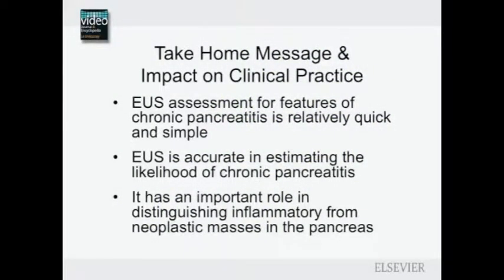In summary, the EUS assessment for features of chronic pancreatitis is relatively quick and simple. EUS is accurate in estimating the likelihood of chronic pancreatitis, and it has an important role in distinguishing inflammatory from neoplastic masses.